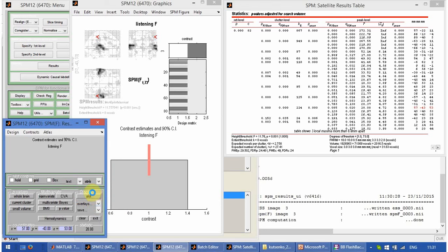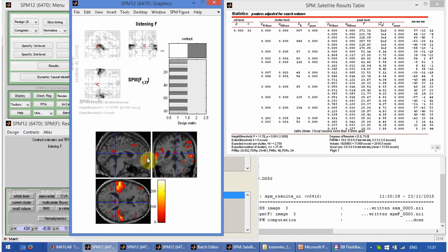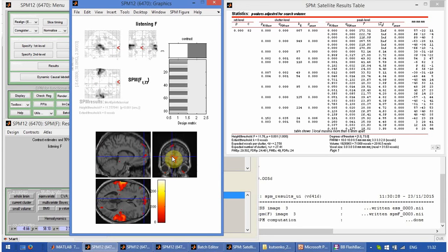Let's try some area where the response is most likely negative. Here, you remember that it was some kind of task negative. How to select this cluster and see where the peak, the maximum of this cluster is?